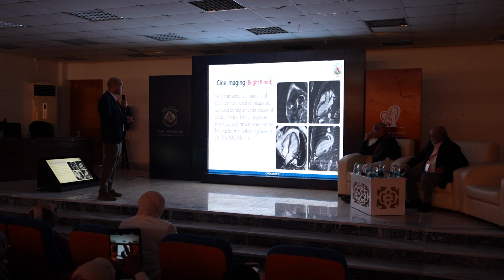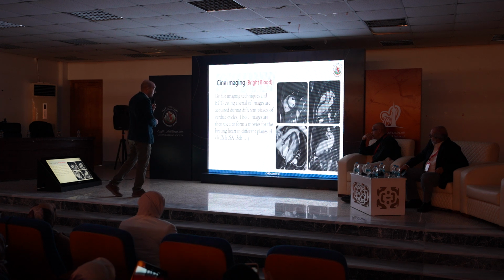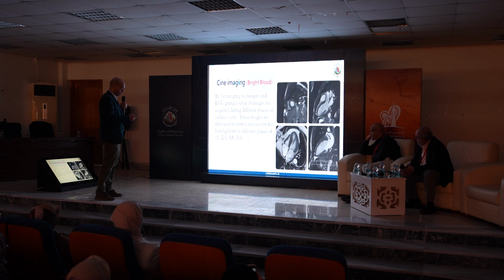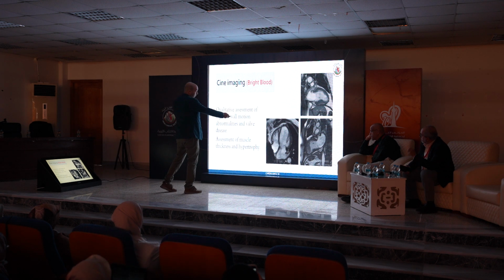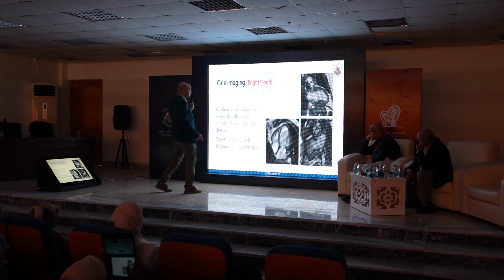At first, the size of the ventricle by qualitative assessment, the function of the valve: is there a valve lesion? Is there any filling defect or masses? Is there hypertrophy of the muscles? Or regional wall motion abnormalities? In this case, we can see the regional wall abnormality and a filling defect inside the left ventricle.